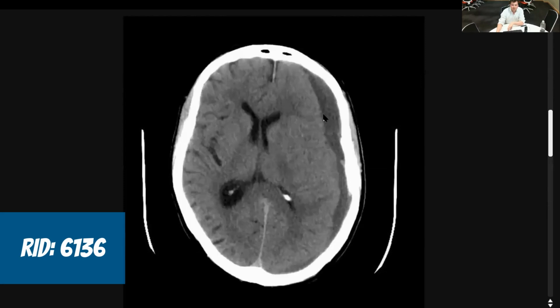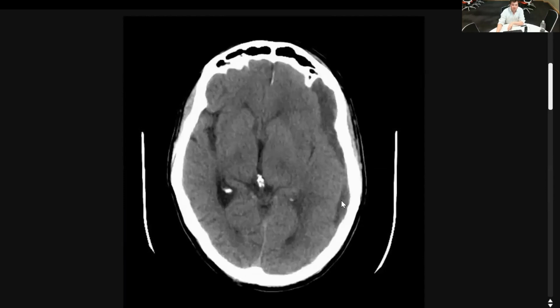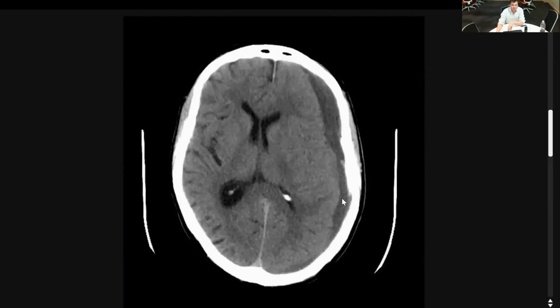And a few weeks later, so after about 3 weeks, it starts to become hypodense to brain. And this is the appearance of a chronic subdural hemorrhage. Vicky, you were mentioning stuff being close to old fluid and old hematomas. Sometimes you can get collections which are the same density as CSF.